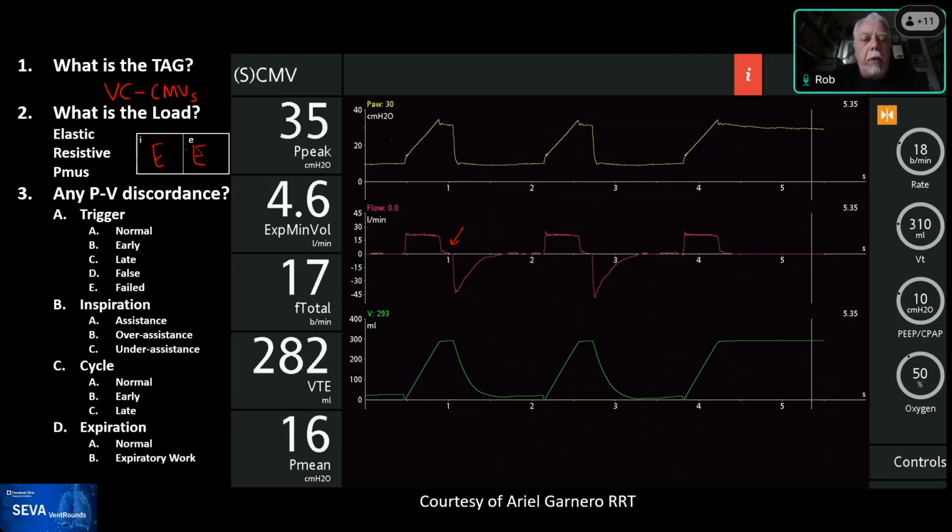So that's kind of a tricky interpretation, right? No, yeah, but I think that you're right on with that thought, Rob, because having a bronchoscope through the ET tube increases the resistance incredibly, and so the amount of pressure required to overcome that resistive load, the resistance is very high, and the compliance of the circuit starts playing into it.